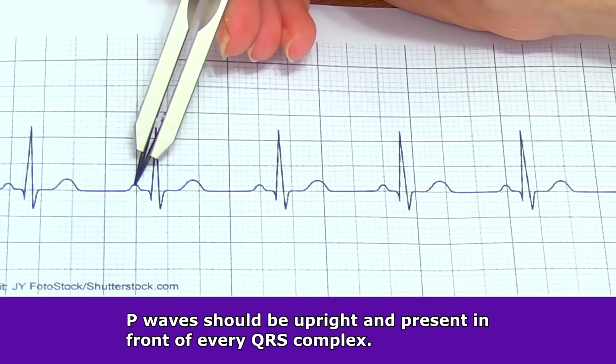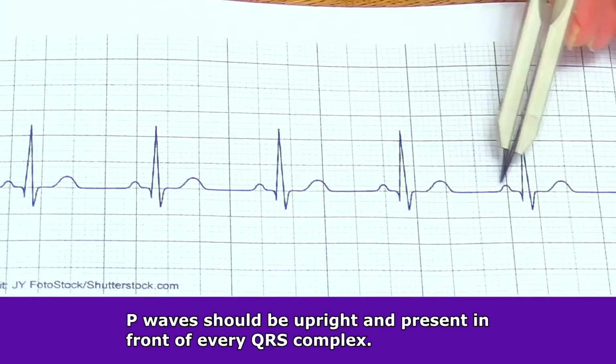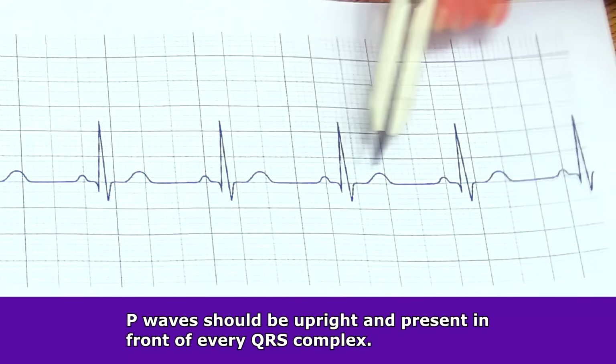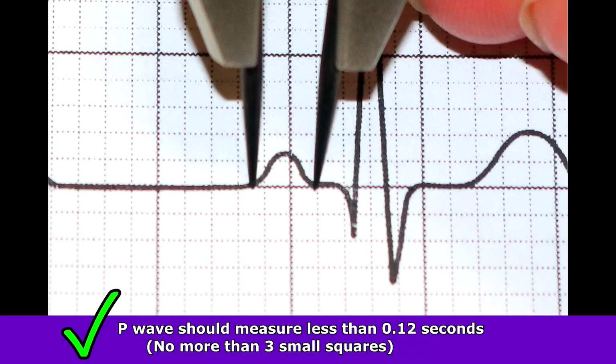Now, how do we know that we have normal sinus rhythm? Well, let's look at these characteristics and criteria that tell us that we're dealing with normal sinus rhythm. When you look at the ECG waveform, you should note the P waves, and there will be P waves present in front of every QRS complex, and they should be upright, measure less than 0.12 seconds, and this tells us about the atrial rhythm and rate.